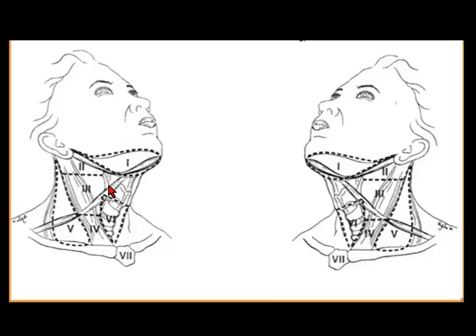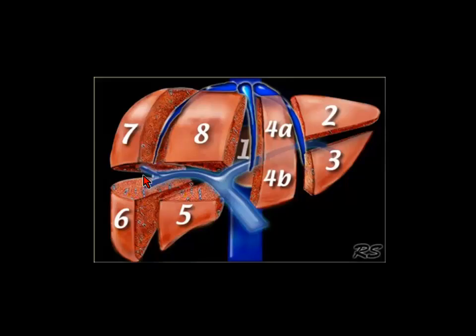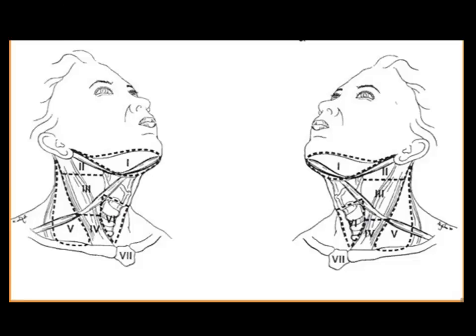Now you've got the hyoid bone, and you've got the cricoid bone. So hyoid and cricoid bone. Anything between these two is level 3. It's difficult on this, but once I go on to the CT, I will tell you. The landmark is basically looking at the neurovascular or the carotid sheath, the carotid artery and the jugular vein. So if you follow the jugular vein on the cross-section axial scan, anterior to that is 2A, and posterior abutting to it is 2B.